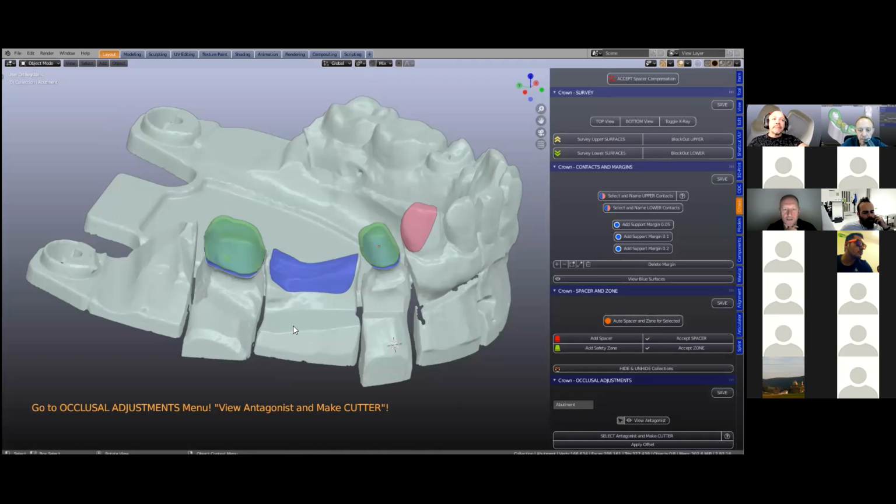Yeah, hi guys. You place quite a lot of importance on the color, as in the blue and the pink for the contacts. Due to my playing around with different themes on Blender and putting different things on, obviously the colors have all changed.